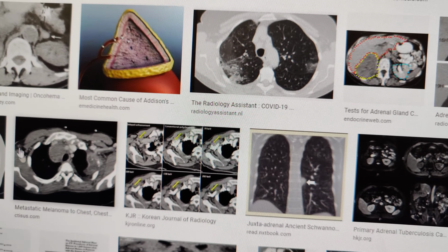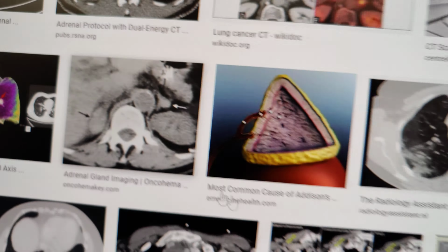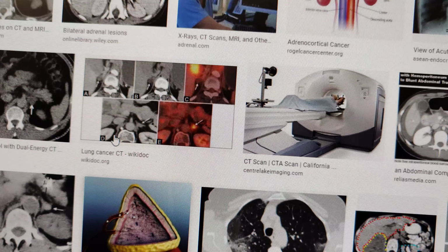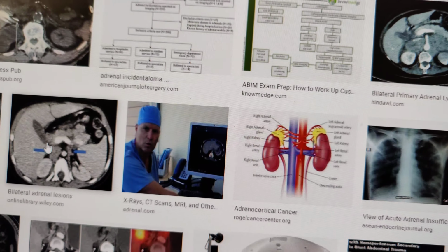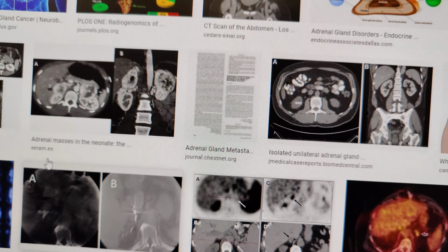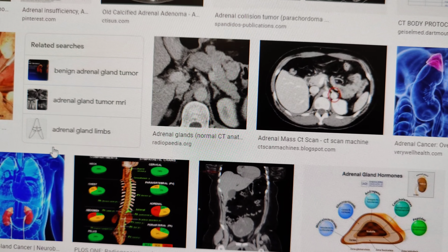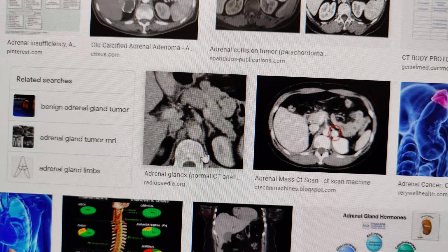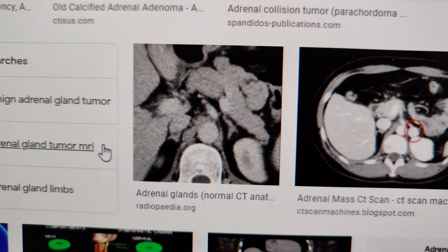So, do you get it? Yes. Here it is again. I think that's all we need to get. So, what do we need for a CT chest scan? Top of the apices down to the kidneys. Kidneys, adrenal gland.